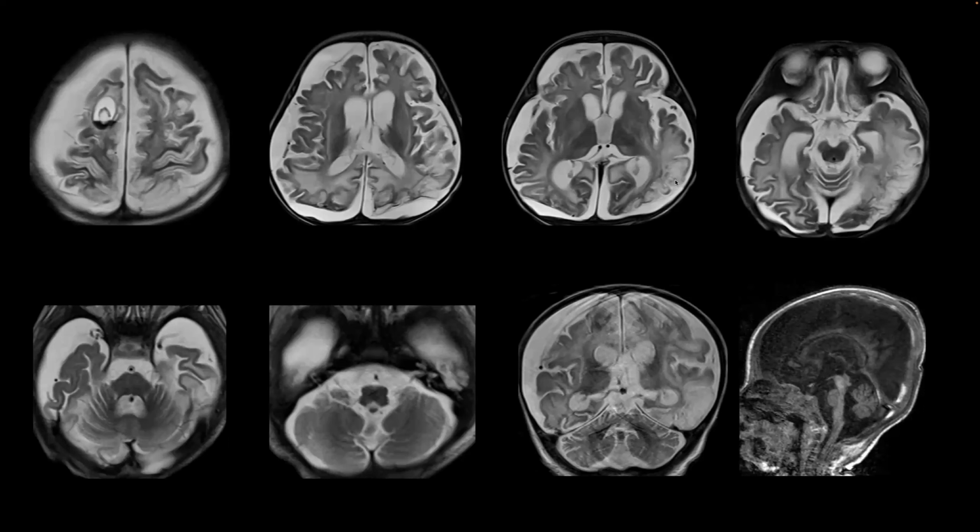Ischemic changes, sequelae of ischemic changes with cortical thinning, especially in the left posterior cerebral hemisphere. Again, subdural collections, hematomas. We appreciate on T1 non-contrast sequences some reduction in the volume or hypoplasia of the brainstem and the vermis, primarily the pons over there, and possibly Wallerian degeneration along the brainstem structures.